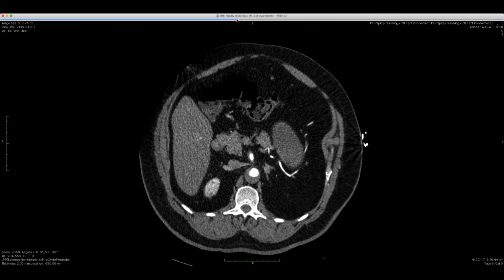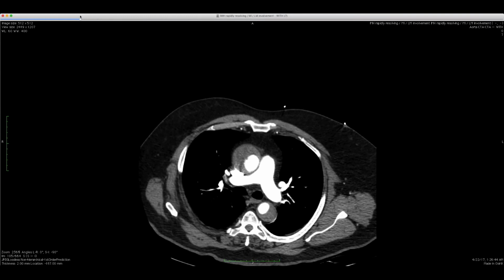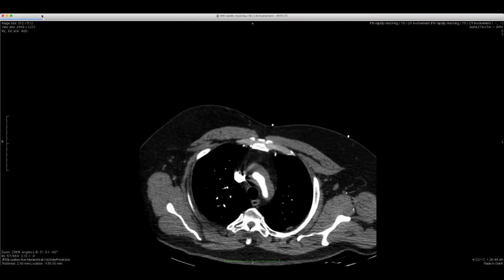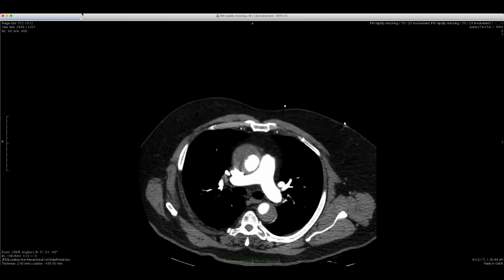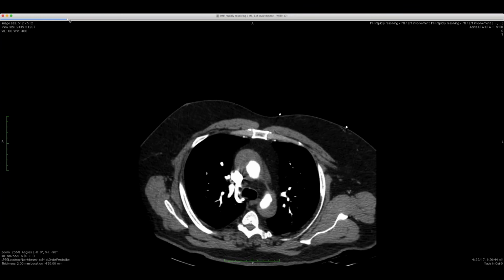Yep. Okay, so this is a befuddling, bemusing case, because this patient came to us from an outside hospital, and you can see here that what at first glance looks like it's probably an extensive intramural hematoma that goes up into the arch vessels, comes down. You can see a couple of interesting things here. You can see maybe a focal intimal disruption right here, this irregularity here.